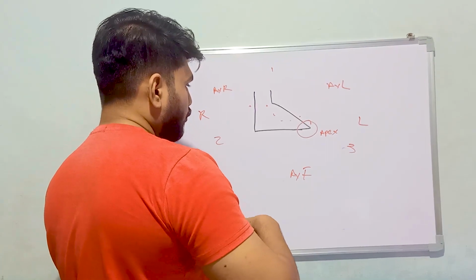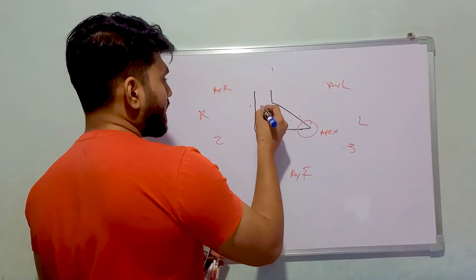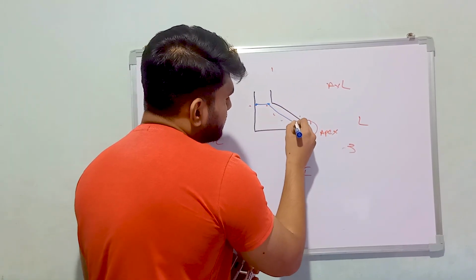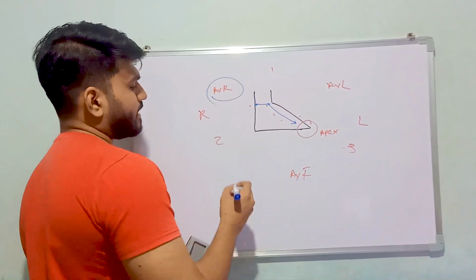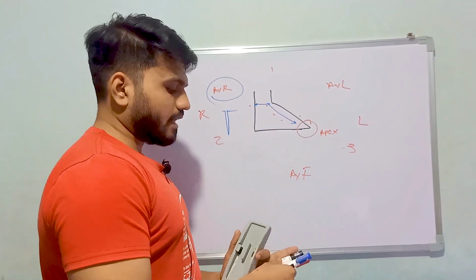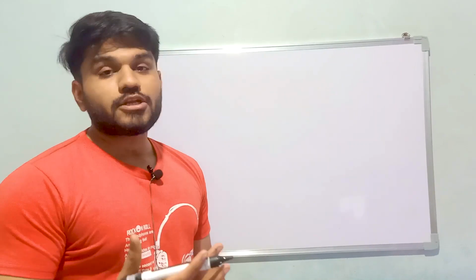In this, you know that our electrical impulses generate from the SA node and go to the AV node and then travel like this. So it is traveling opposite to the AVR lead. That's why AVR will always be negative. So now we are going to understand how you will calculate the heart rate.